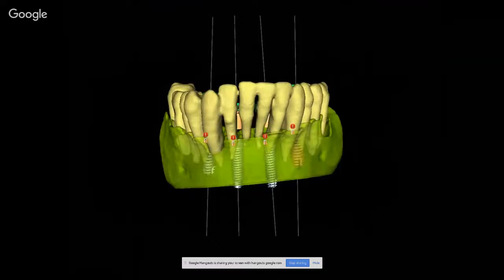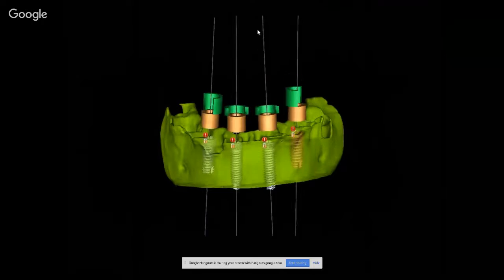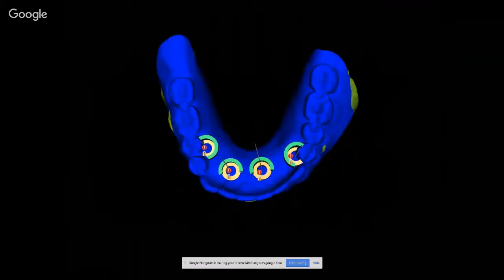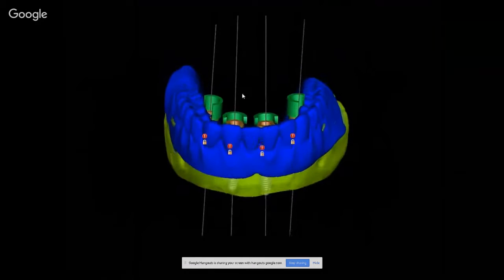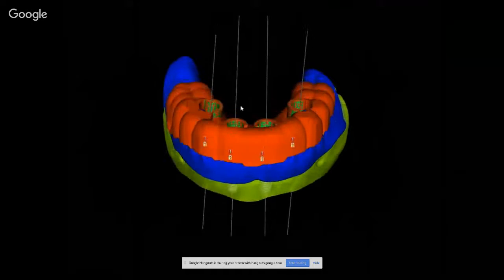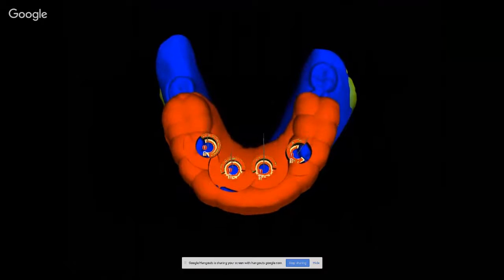As you can see here, I lined up and placed my implants, and I was able to digitally extract the segmented teeth, almost similar to what Corey did for us in the last case. But in this case, I was able to take cone beam data and digitally make a digital denture that's being widely discussed now, and make sure that lined up prosthetically with the final outcome for the immediate load situation, and then also make a surgical guide for the denture and for the mandible.